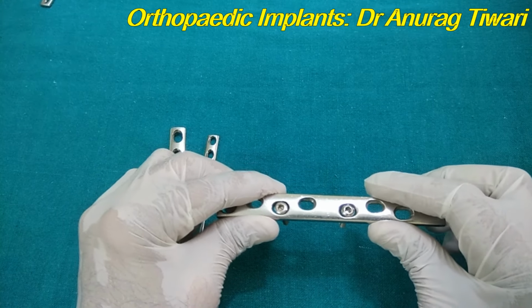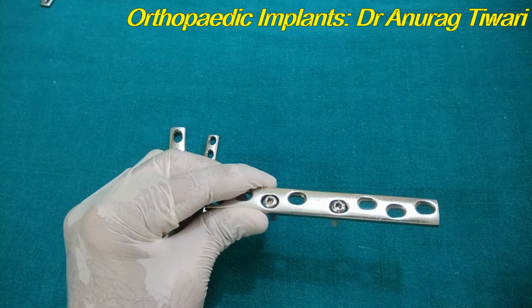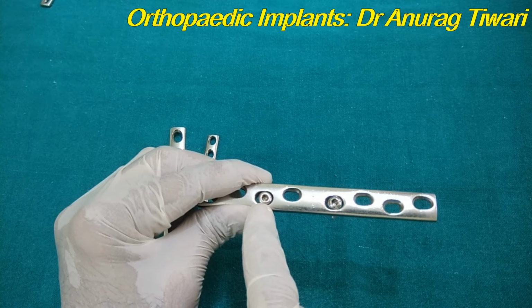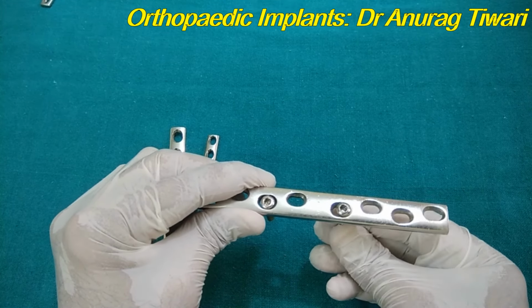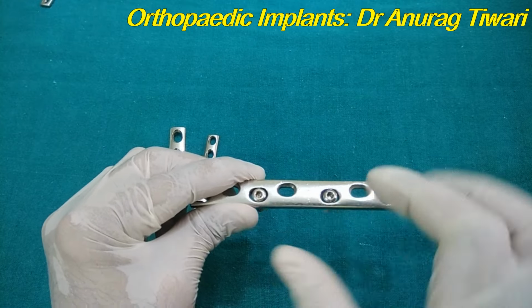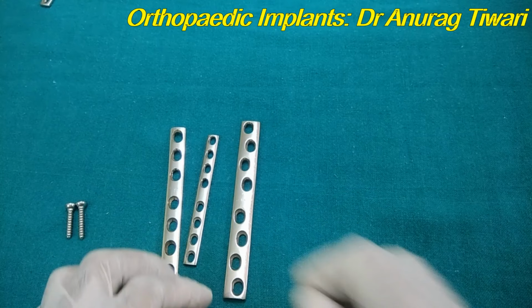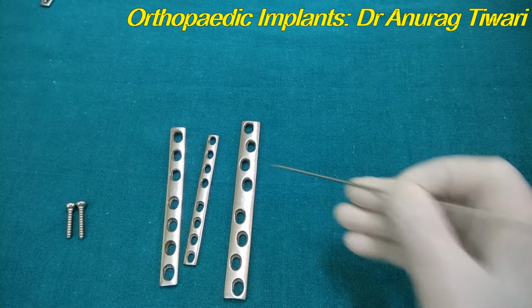If we do not want the compression, then just insert the screws in the neutral mode, that is the center, and all the screws should be in the center. If we want the compression mode, the one screw on this side should be in the center, and the opposite fragment should be fixed in the eccentric mode, so that we can get a compression at the fracture site. So that is the principle, the spherical gliding principle. How to identify it? The holes are oval in shape in order to have a compression mode.